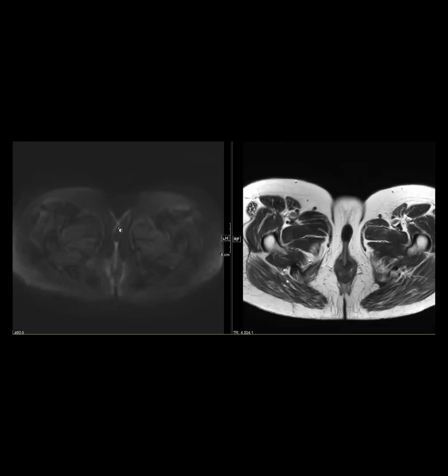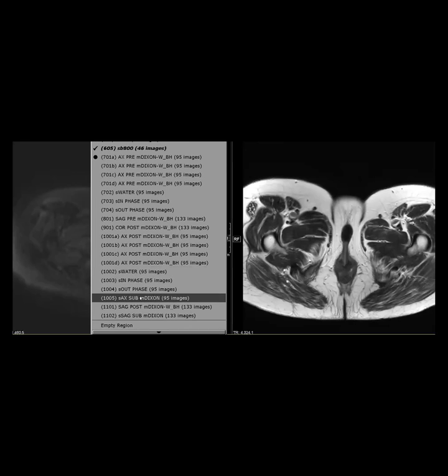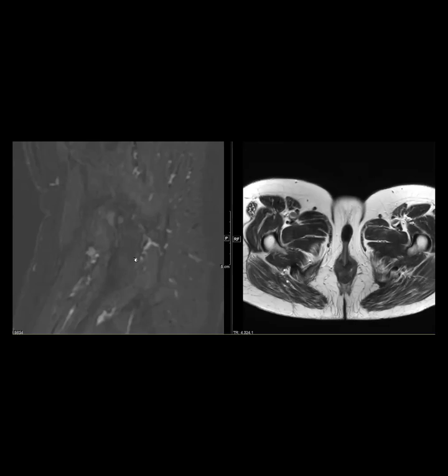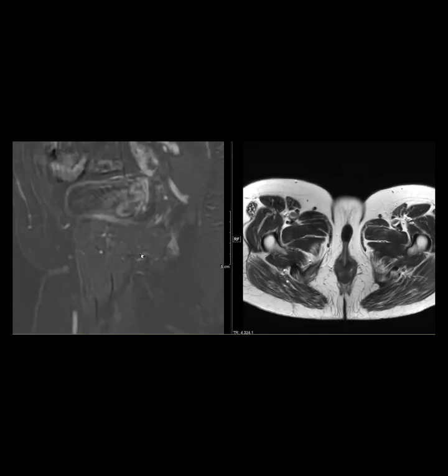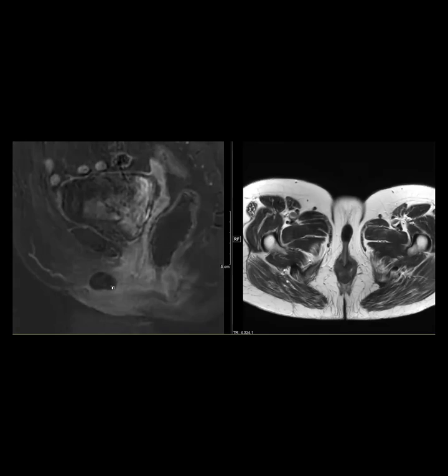There was no restricted diffusion, as you can see here. So let me see if I can get the subtraction. Do you think the GYNs are going to go solve this for her? I haven't, and this is a subtraction, so there's no enhancement. Based on some case reports on how they manage these, it seems like they have to unroof it and take it out.